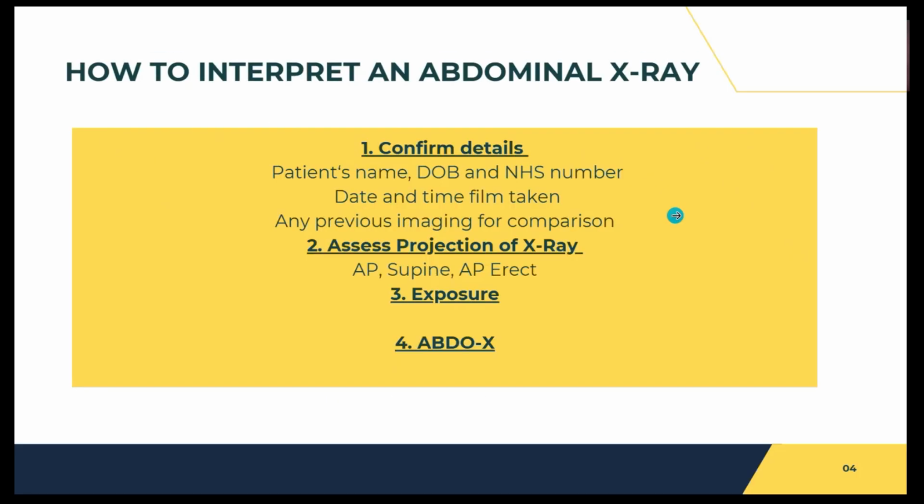So how do you interpret an abdominal x-ray? Whenever we look at an abdominal x-ray, the key is structure. Abdominal x-rays can appear chaotic, so following a systematic approach prevents you from missing important pathology. First, I always like to start by checking the patient's details, so their name, their date of birth, their NHS number, and the date of the image. Then you can compare with any other previous imaging. This is important because chronic changes can look worrying if you don't realize they're long-standing.